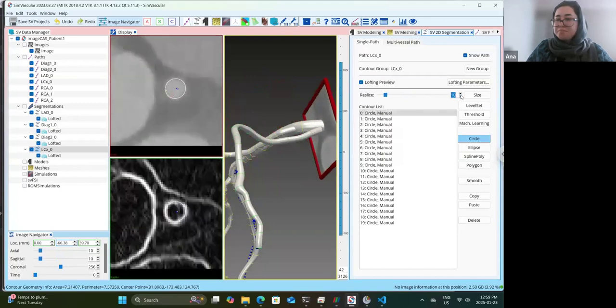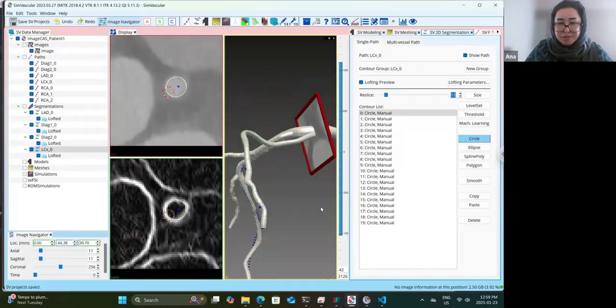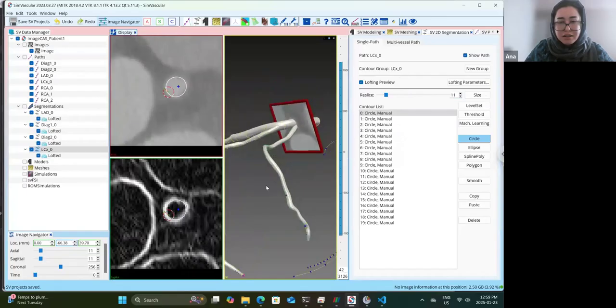Okay, good. So let's again save the project, and I'm going to move on to the modeling.